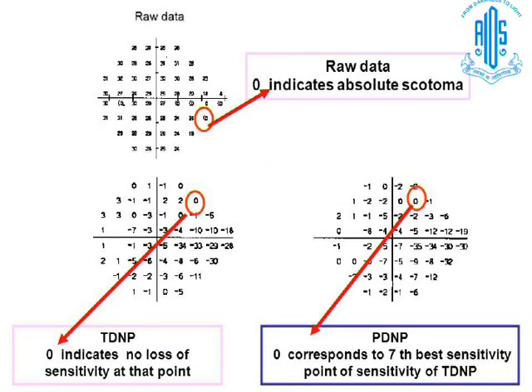Coming to the interpretation, the interpretation of the single field analysis is a broad term. Actually we interpret the scotoma. We always start by interpreting the probability plot, so the correct terminology is the interpretation of the probability plot. The art of interpretation is to always eliminate the artifact.